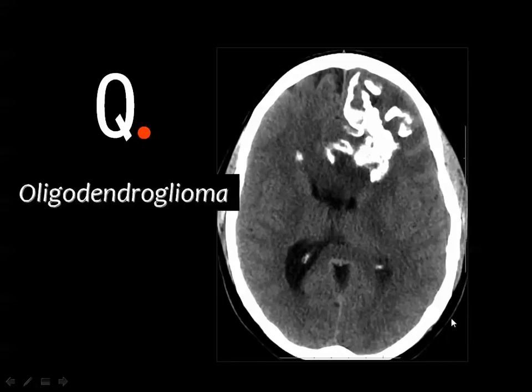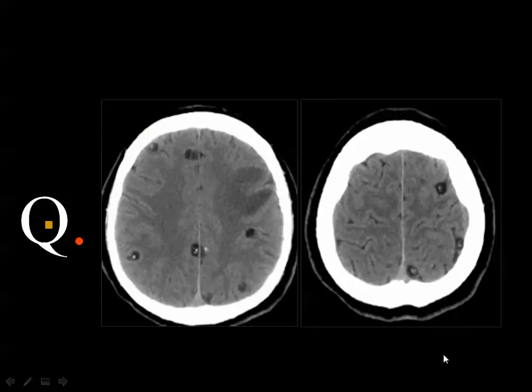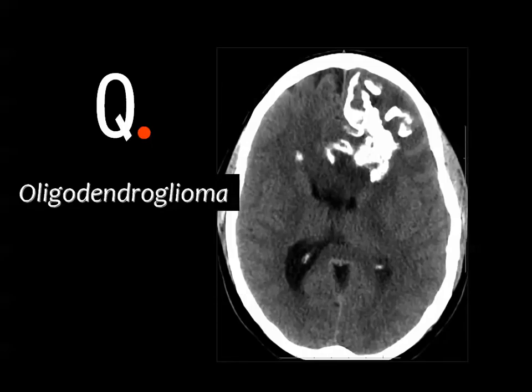Oligodendroglioma. The calcium in the arteriovenous malformation is not that heavy. It's just linear pattern of calcification, and the AVM does not exert a mass effect unless it is associated with hemorrhage. Yes, calcium in the Sturge Weber should be in the gyral distribution on the surface of the hemisphere, but this is inside the brain parenchyma.